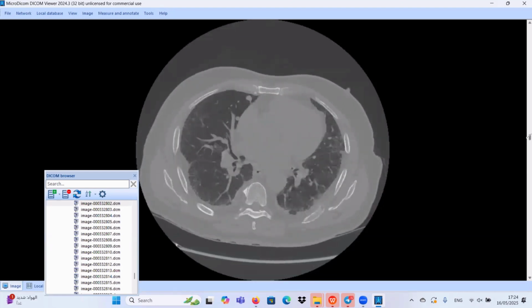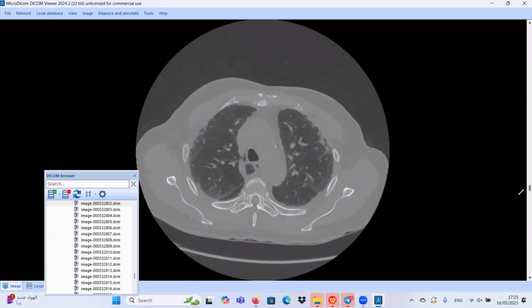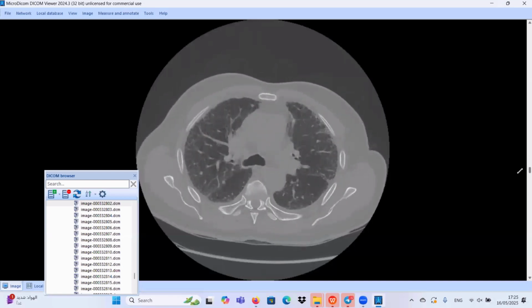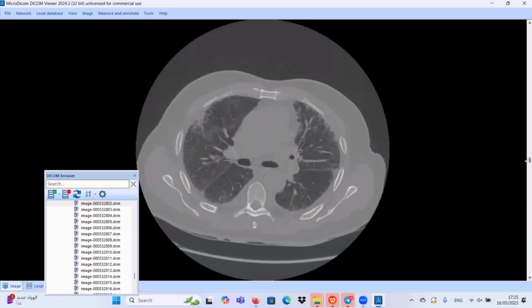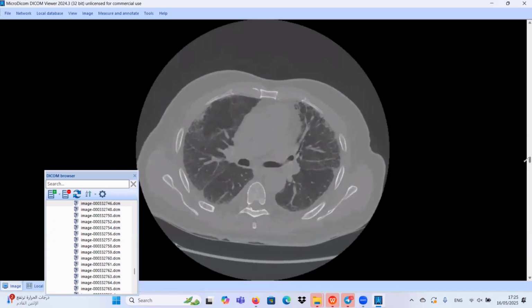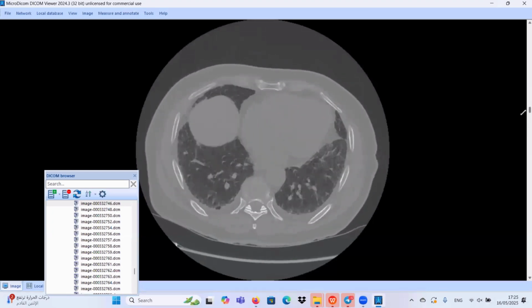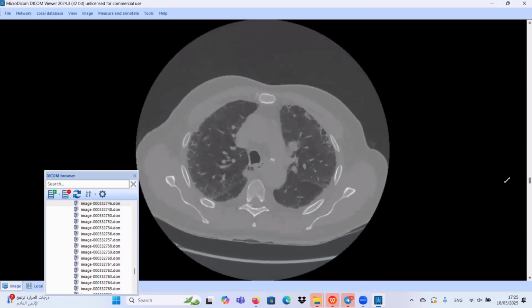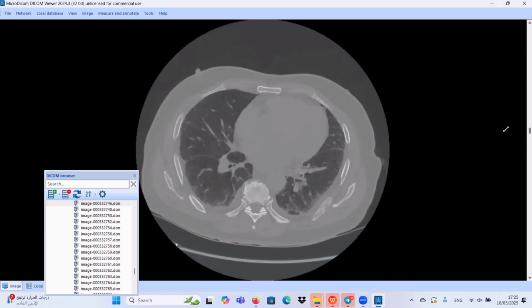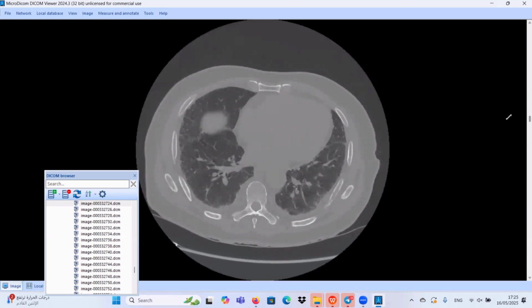But in conclusion, we have here double pathology. We have usual interstitial pneumonitis, and also we have pulmonary nodules, maybe metastatic, and also there is osteolytic aggressive lesion involving the posterior aspect of the left seventh rib. You should search for any primary lesion, and metastatic workup is recommended for this case. I think that's enough for this case. Let's move to our last case, please.